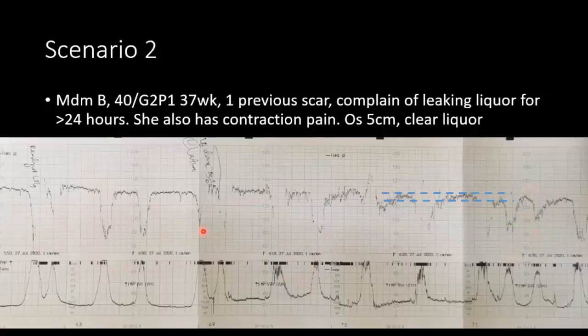Is there a concerning characteristic? Yes, there is, because number one, there is no shouldering that you can see. Number two, you can see it is actually wide, more than 1 cm. Some of the decelerations have reduced variability within. This one also has reduced variability within. So I would say that this is a variable deceleration with concerning characteristic, lasting for how long? 1, 2, 3, 4. This is easily a 45 minutes tracing. And whether it is persistent or not, at one glance, yes, it is persistent.